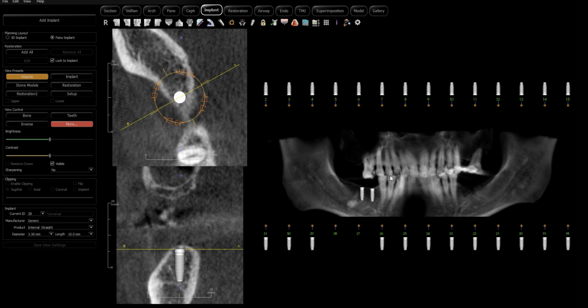One may ask, how many implants do we place? Lots of clinicians will say first molar occlusion is more than a patient needs. It also gets more difficult to place implants in the second molar areas. With that said, this patient doesn't have an upper second molar. So I think in this situation, we're going to be safe with just 2 implants. With that said, if you wanted to place a third implant, I would splint the implants together and do a splinted bridge.